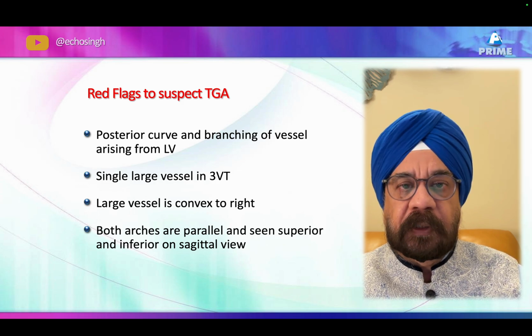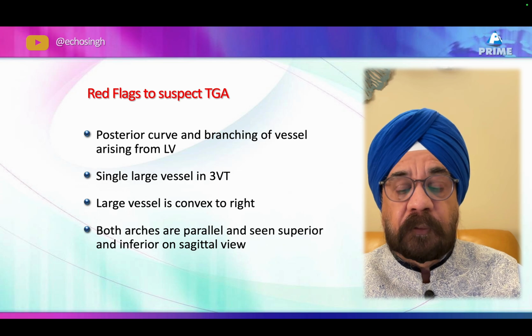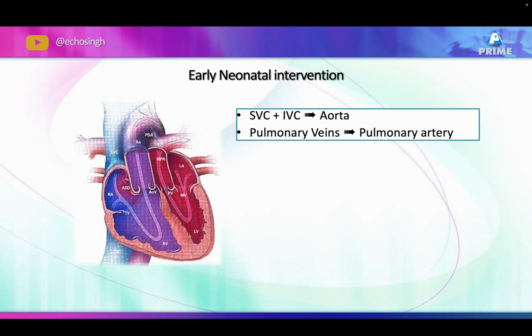Once you finish doing fetal echo, go back again, even if you finish, look for these two diseases because they can create a big problem in the neonatal period. Now, for a TGA, because you understand the deoxygenated blood remains on the systemic side, and there is no communication between saturated blood and desaturated blood, right?